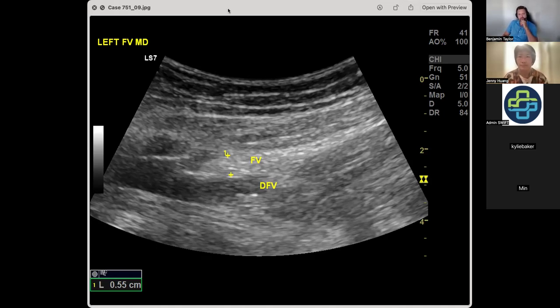I actually don't know either, but I'm going to go hypoechoic or the change as... Sorry, hypo for, okay, so acute clot, hypoechoic or hyperechoic? You got a 50-50. I'm going to go acute clot hypoechoic, chronically goes hyperechoic.